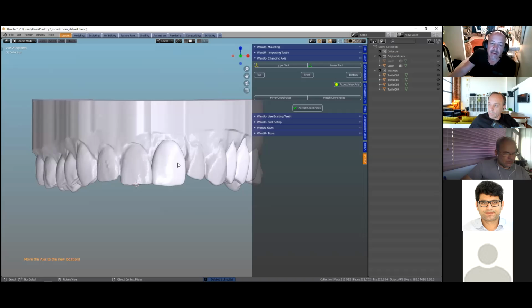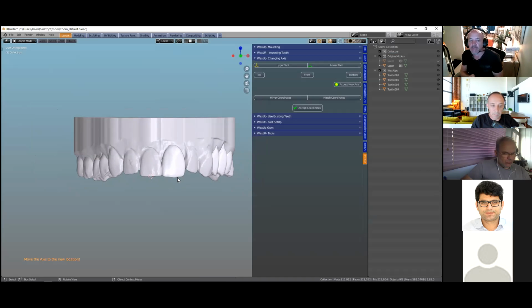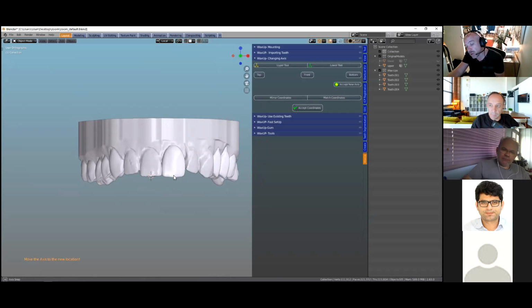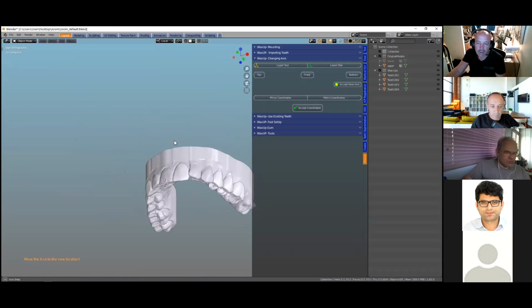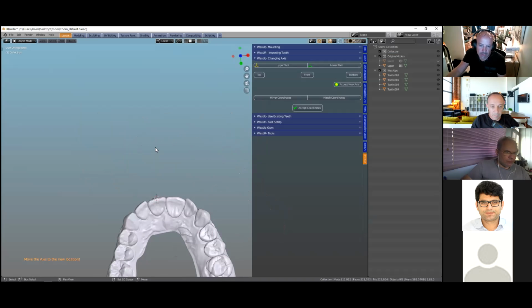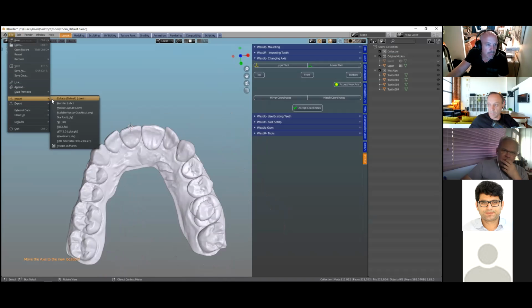So now obviously the shape of this tooth is not so cool. And this is why I was talking about earlier of cutting them out, especially with a front tooth, unless you've got a tooth library where it looks very similar. So, yeah, what I'll do is I will bring in another model. So a different file.